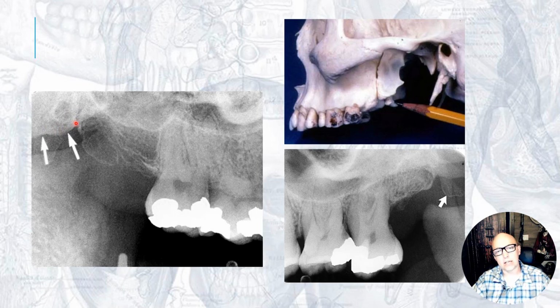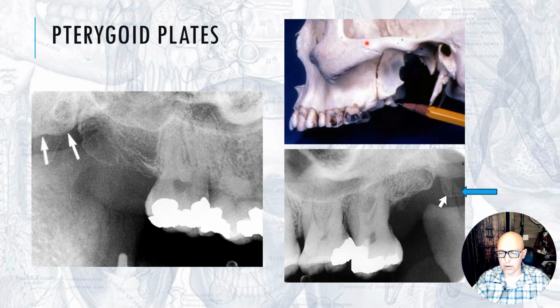And I guess if I asked, was it lateral or medial? The lateral one is larger, it stands out more. Here you can see the lateral pterygoid plate. It's larger, it's fairly bulky, although it is fairly thin. But typically what you're seeing is going to be the lateral plate. And so here's another arrow for you. What is that pointing to? This little kind of hook-shaped thing that extends downward. And we're pointing at the same thing with the pencil lead here.